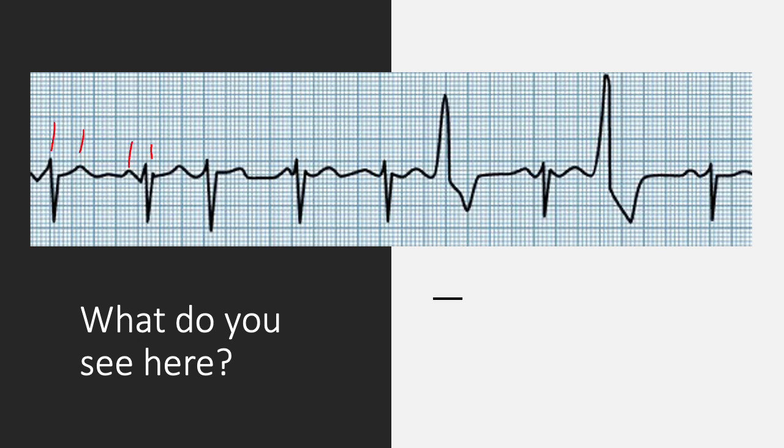Here is a P QRS T, and then all of a sudden we've got a QRS, and there's a missing P here, and then T, then P QRS T, P QRS T, and then a significantly different QRS complex with an inverted T wave, and then P, QRS, T, and another significantly different QRS complex with an inverted T wave. And of note, for both of these, there is a missing P wave as well, and then back into a P, QRS, T.